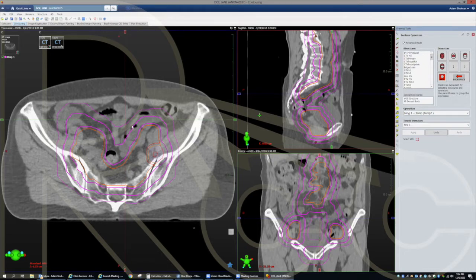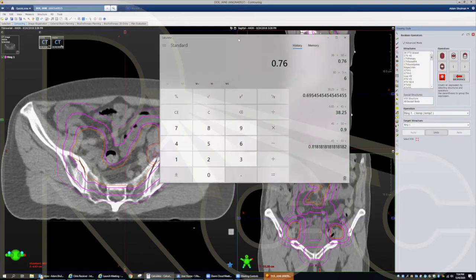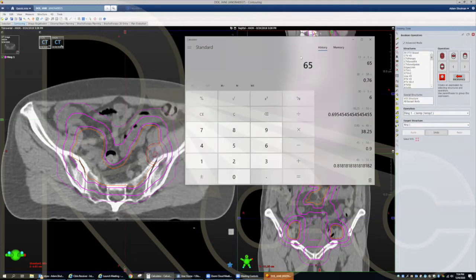And ring 2 now is about 1.3 cm away. So if you think about it, 13 millimeters times 5. It says it's a 65% drop off, but that's obviously not going to happen. So I'll usually limit this to, I'll just say it'll drop off about 40–45%.